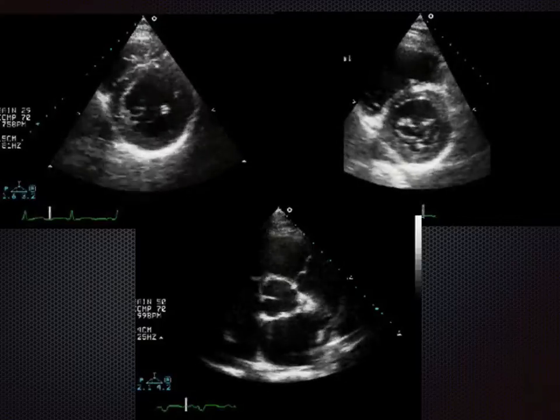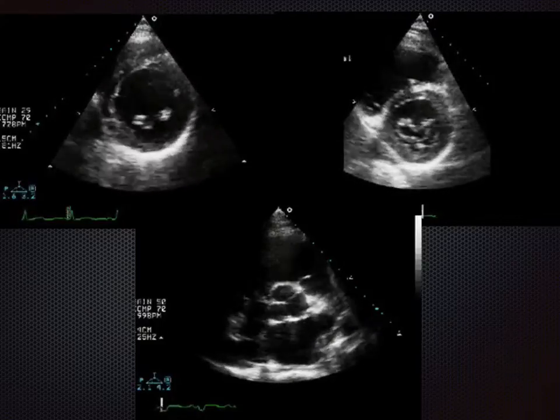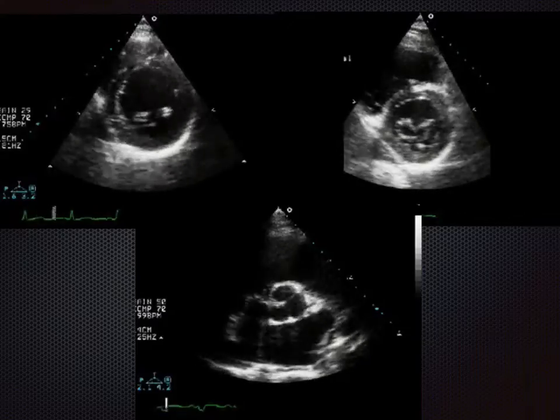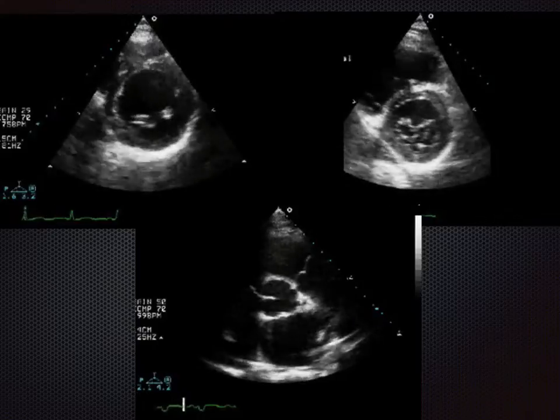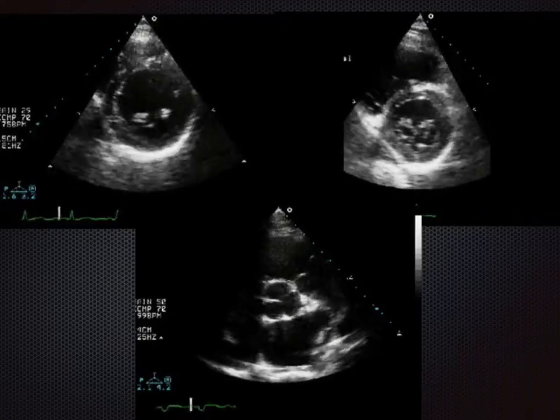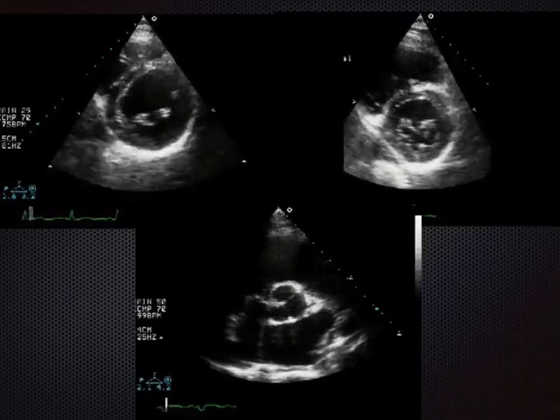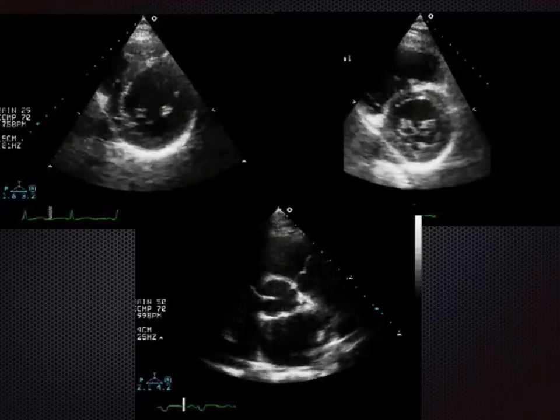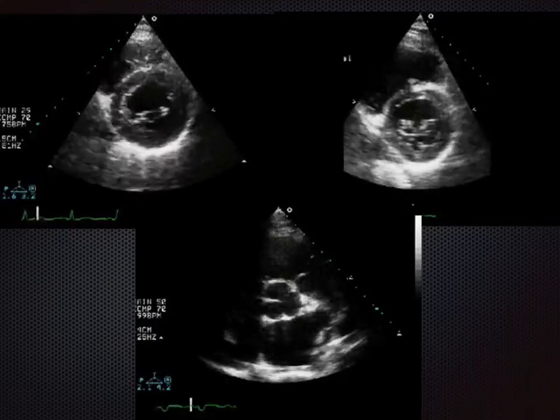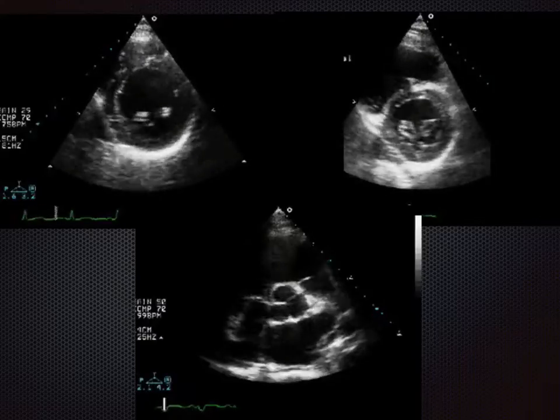Another good thing to do is, if you imagine sticking your thumb in the middle of the dancing left ventricle donut, all the walls should come towards it, and that reflects a radial contraction. So the radial contraction inwards should reduce the internal diameter of the left ventricle by about a third during contraction. So that's called fractional shortening.